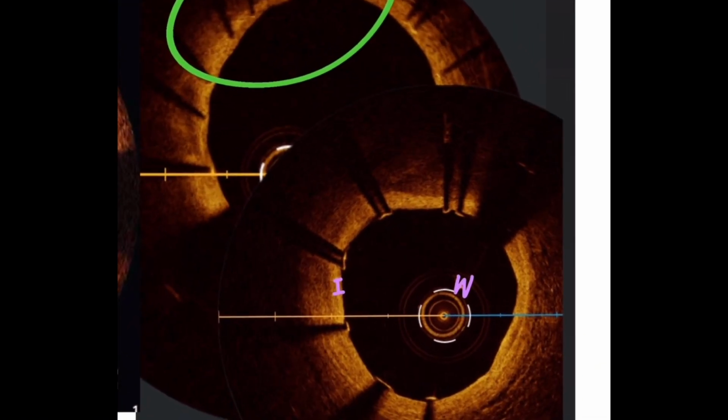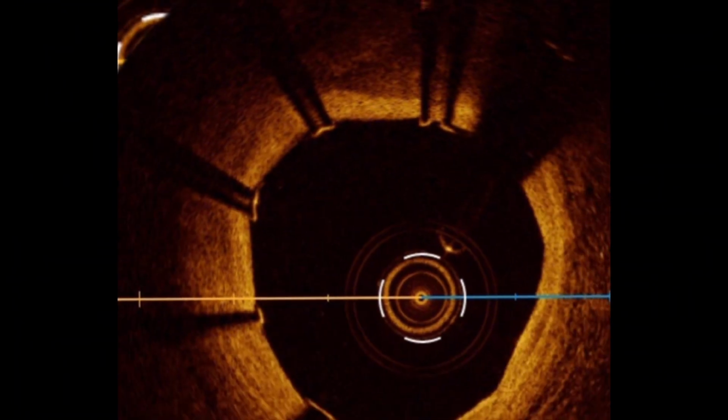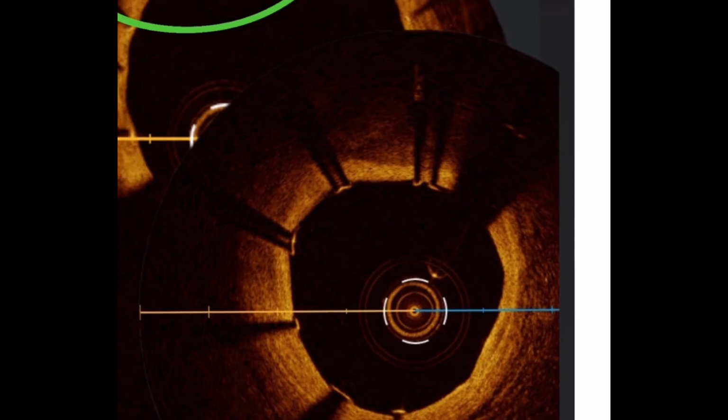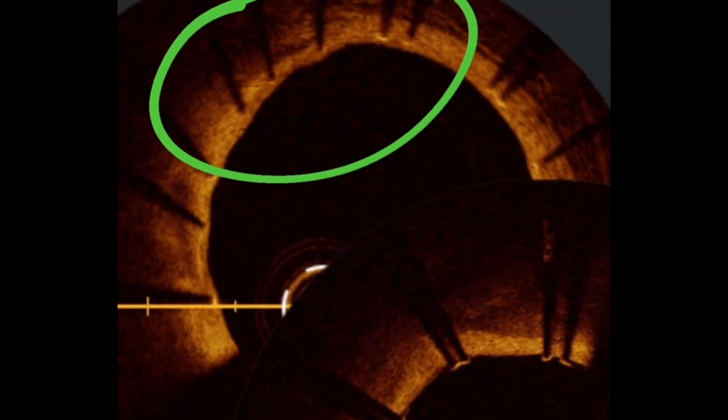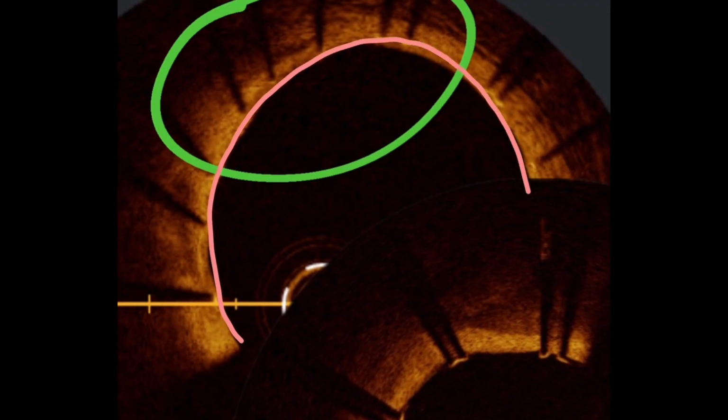Now, what you can also see is the endothelialization process itself, which is kind of cool. I would look at this and say this is an exposed stent strut. It's literally the intima, and the stent strut is on top of it, and the lumen and blood is right here, which is what it's going to look like when you place a fresh stent. It is not endothelialized. It is not healed yet. You're looking for the endothelium to develop over it. If they come back, or you're looking at an old stent, this is what you're looking for. The stent strut is ingrained into the intima because the endothelium grew and developed over it, and now you have a nice smooth surface and no exposed stent struts. That is the goal.